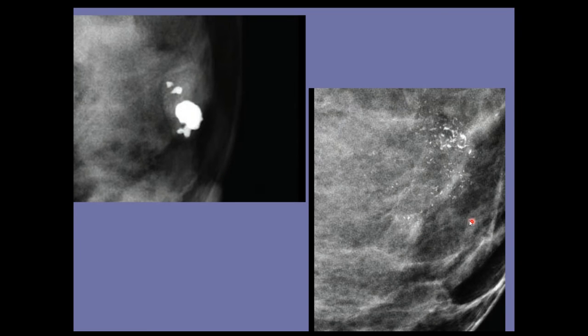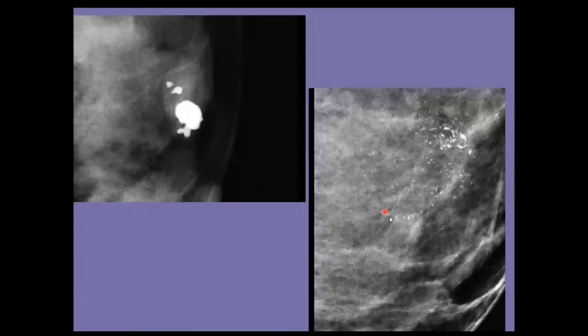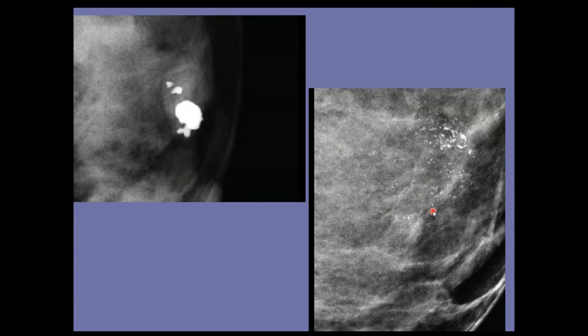And here in the next picture, we can say there are microcalcifications scattered in an area. Okay, it raises the suspicion of malignancy. It can be benign also. So we have to perform a biopsy in this area because there is no radiopaque mass. There is no mass here. The only thing we can see is the microcalcification. This is the suspicion of malignancy. We have to perform biopsy.